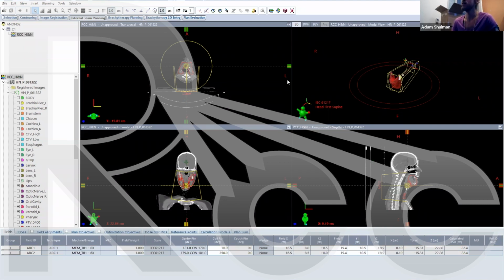You can take these same principles that we've taught in the Shulman method and apply them in other creative ways, just based on the dose falloff. But we're going to teach you this method today. So I'm not going to focus too much on contouring or anything else. I'm going to quickly go through that. If you have any questions about the contour, you can go back to my last session, where I explained it in a lot more detail, and refer to our PDF that explains the treatment planning method.